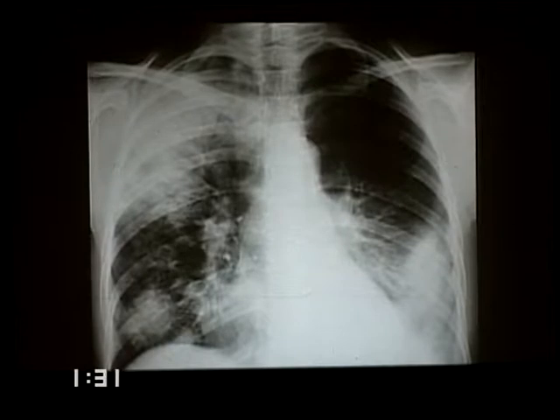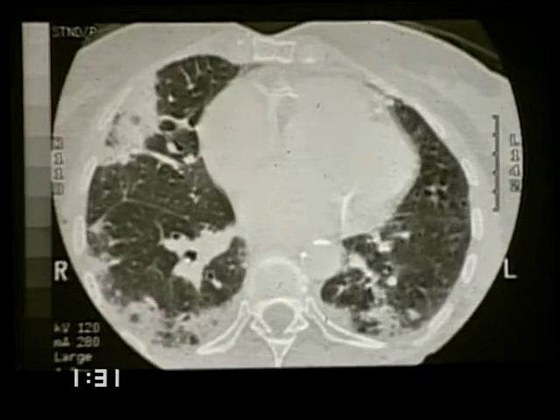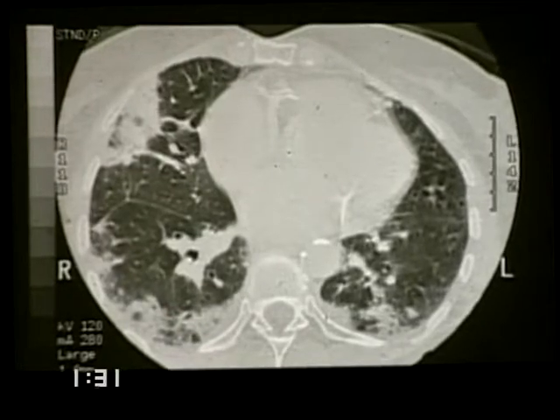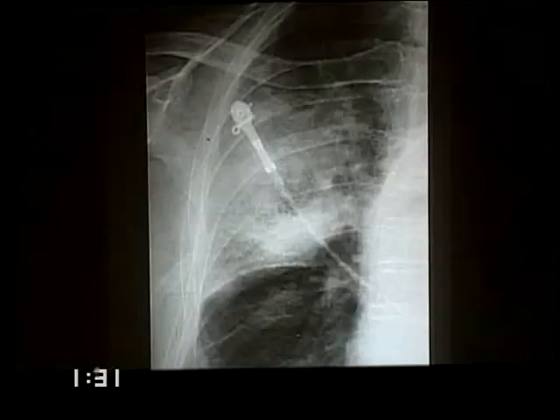One is hemorrhage from a vasculitis, a very patchy, rather nonspecific, quite indistinguishable from bronchoalveolar cancer or multifocal community-acquired pneumonia. And beside it is another example of an airspace disease, which is rather more opaque, quite curiously peripheral in distribution, and that happens to be a bronchoalveolar tumor.